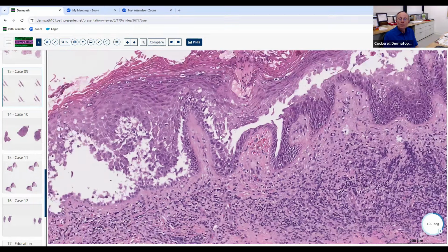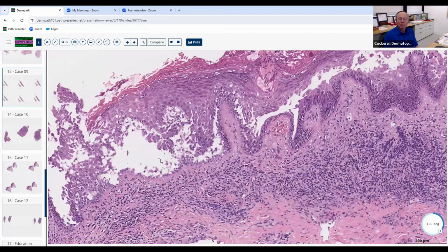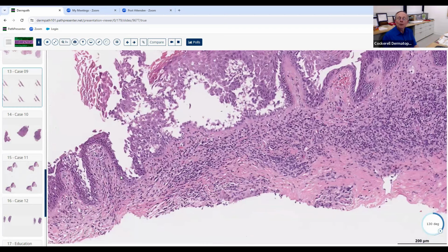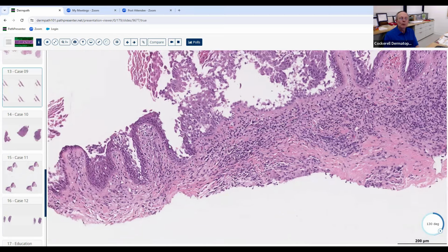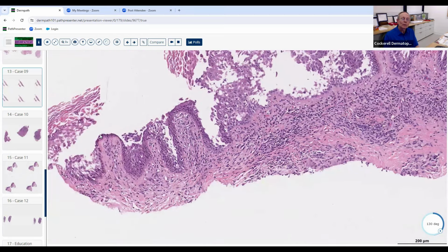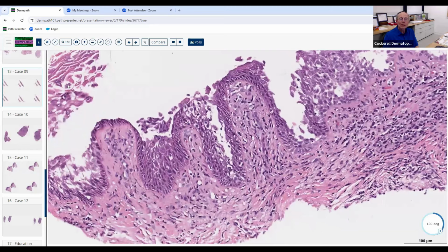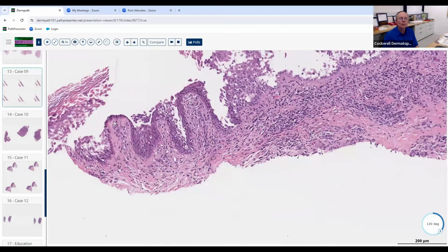So once we get there, we ask ourselves, what's the level of the acantholysis? And this is where Mother Nature doesn't always read the textbooks. So if you read the textbooks, they say, well, if it's pemphigus vulgaris, you get the nice individual layer of tombstones at the base of the epidermis, and you get the overlying epithelium that doesn't really have a lot of acantholysis. You get a kind of normal appearing epidermis at the top, and then the little tombstone residual cells at the bottom. That's what the textbooks say you see.